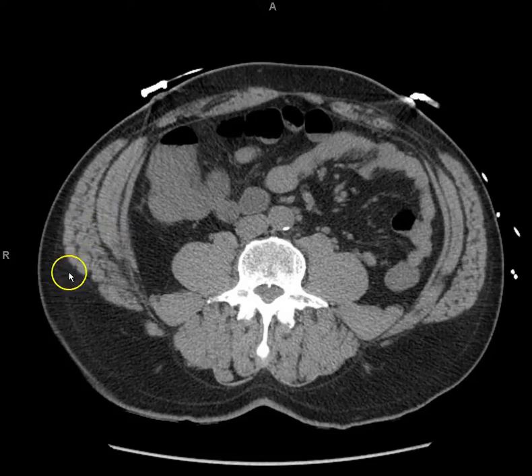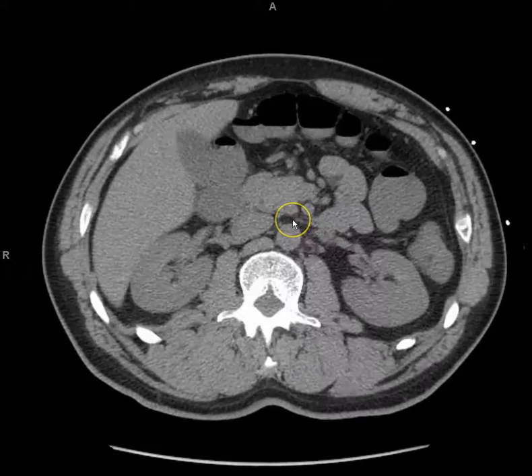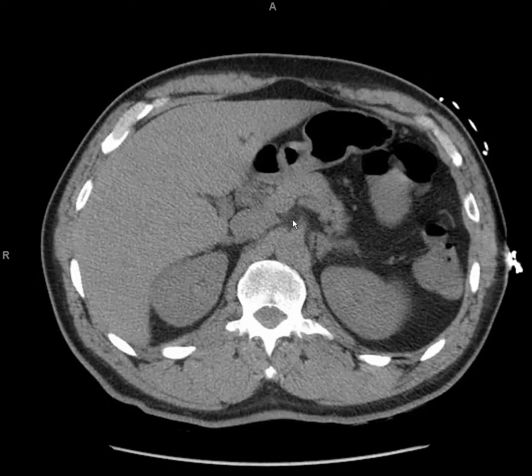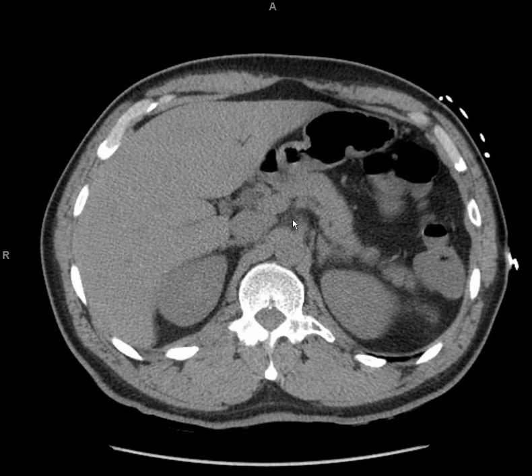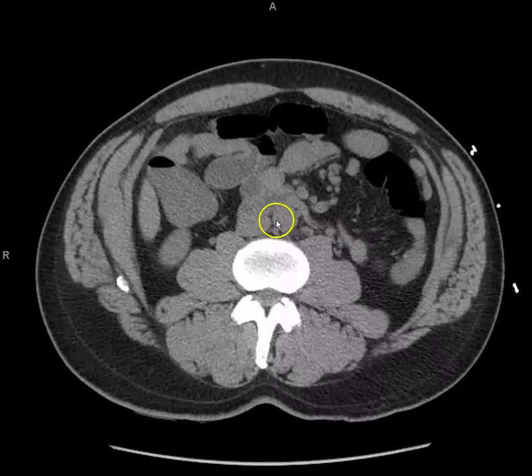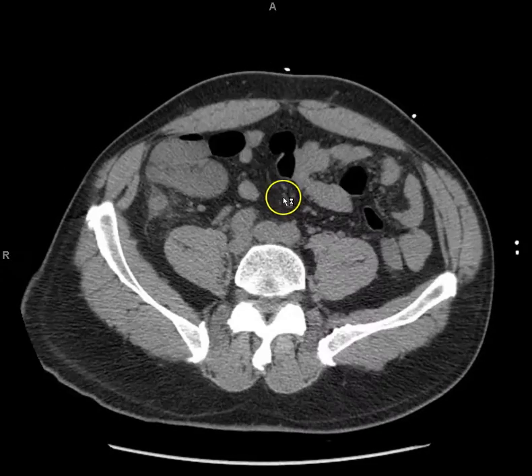So very well defined musculature here, you can see. So used to seeing the flattened, flat, thin, no muscle. Yes. This is what happens when you exercise and take care of yourself. How old is it? This is a 55-year-old male. You can get appendicitis at any age, in anyone.